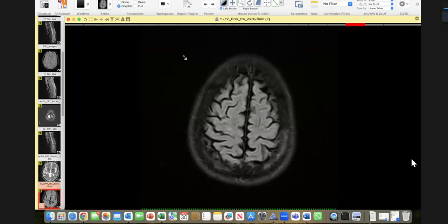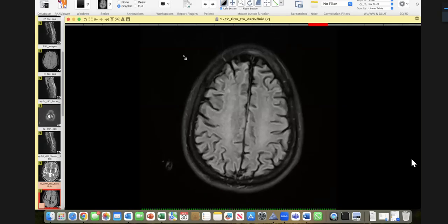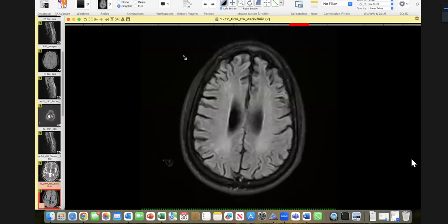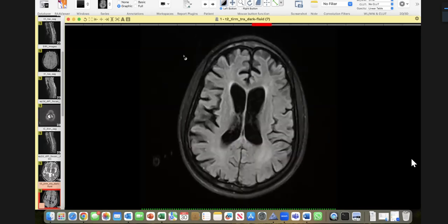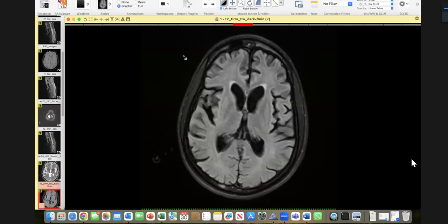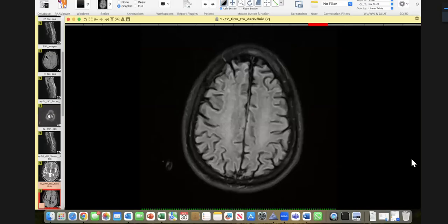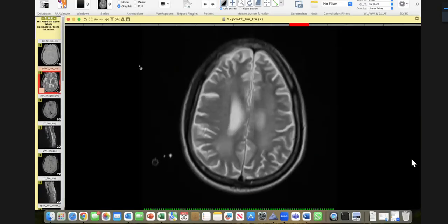I am examining the white matter. There are some white matter hyperintense foci. They are at the deep white matter of both frontal horns, notably on the right. In addition to the periventricular slight hyperintensity, the posterior fossa appears normal. However, still the striking abnormality is the, can I examine more sequences like T2, T1? Yeah, so this is a T2.